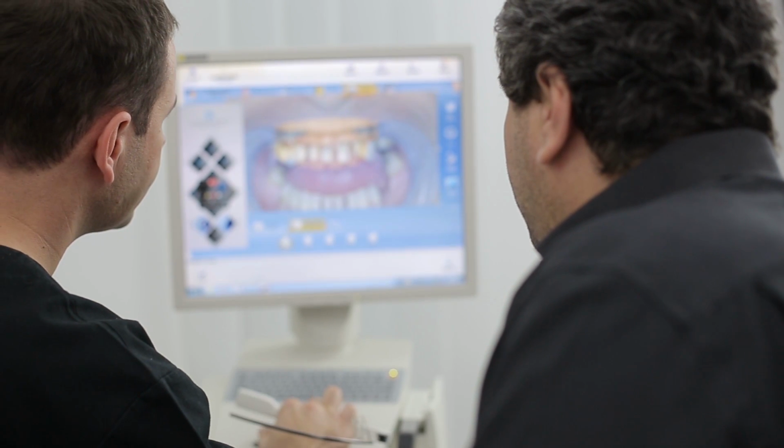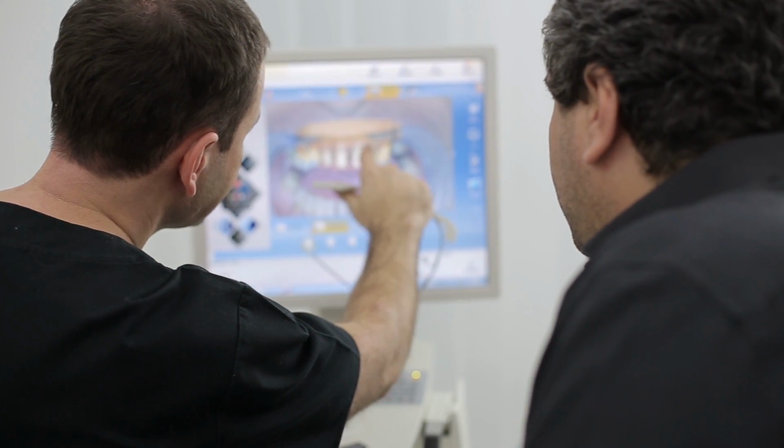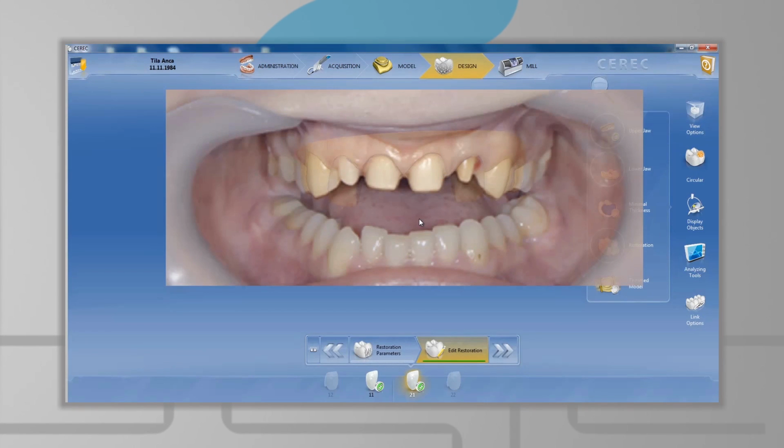G-Design users can check the final result and see if the dental aesthetic has been done according to the facial axes. The second part of the application consists of transferring the axes and the incisal edge onto the 3D model for a precise guidance in the dental design. The calibration will follow the gingival margin, the midline papilla, and the unmodified teeth, and will be done by repositioning and size adjusting the image of the mouth cropped from the portrait photo of the patient.